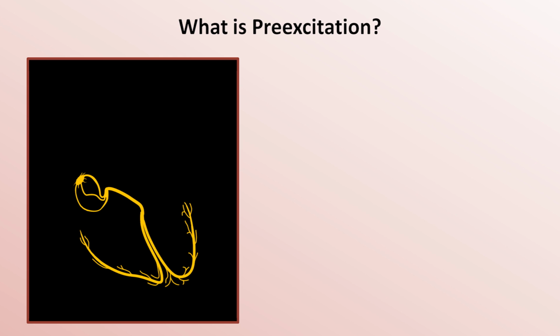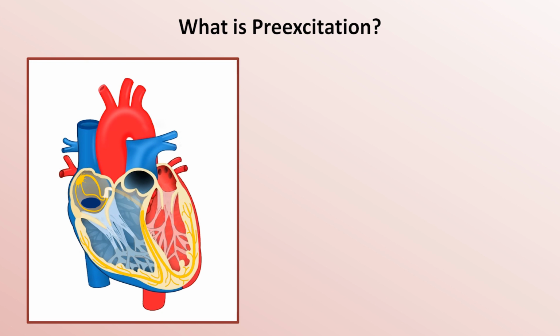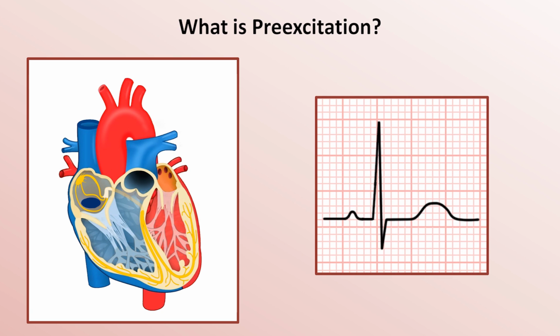Now, here is the conduction system inside the heart. You can see that the right and left atria get depolarized as soon as the sinus node fires, which in a real beating heart would lead to atrial contraction. Then after AV delay, there is ventricular depolarization, which utilizes the efficient and quickly conducting His-Purkinje system. The consequences of this on the EKG are a P wave with a PR interval of 120 to 200 milliseconds, followed by a brief and sharp QRS complex lasting less than 120 milliseconds.